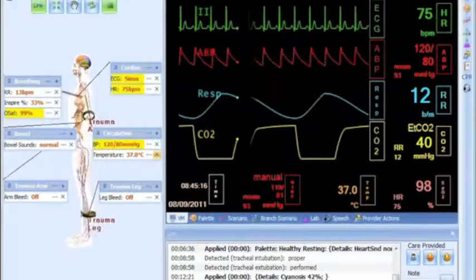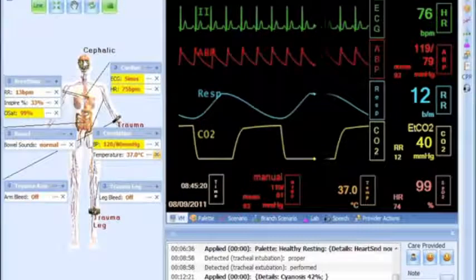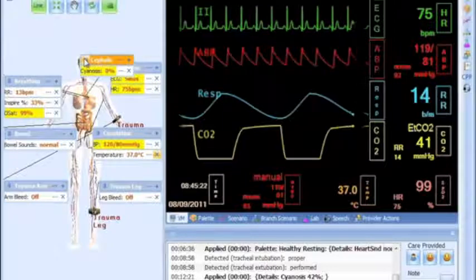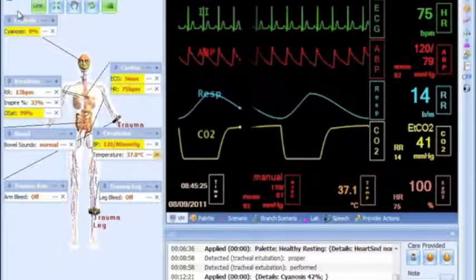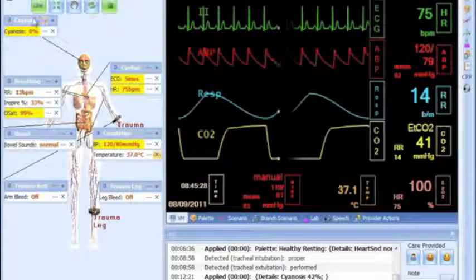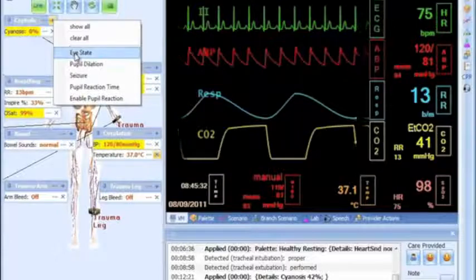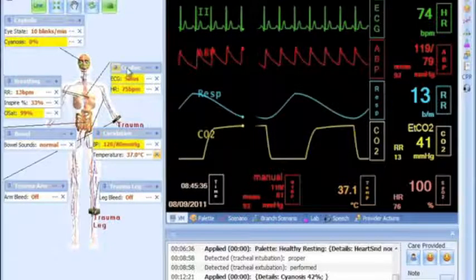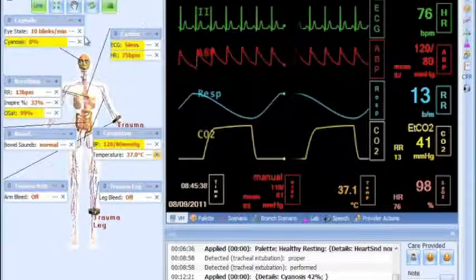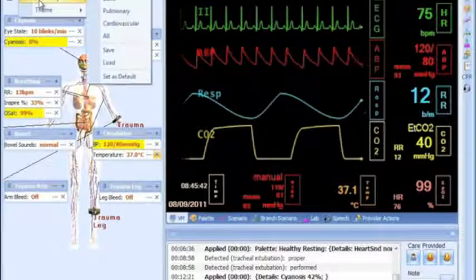Once a region is clicked, a regional status window will open to show the available parameters. This window can be locked, allowing constant visibility. It can also be dragged to a desired location. Click on the plus sign on the top right to add more parameters if desired. By locking regional status windows and editing parameter displays, you can create custom status layouts for your convenience. Status layouts can be saved and loaded at any time.